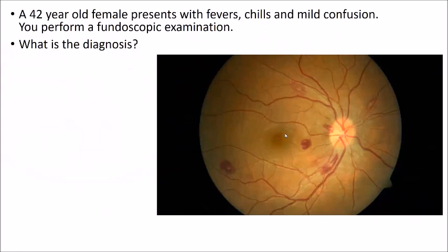Suppose this picture. As we focus the light towards the eye, possibly you have seen the doctors doing the fundoscopy. You have done it also obliquely from the lateral side. So you are focusing the optic disc medially in the eye. So this is the macula. Usually the macula remains on the lateral side of the optic disc. So what will be the eye, right or left? This should be the right eye. Definitely. Thank you very much, sir.